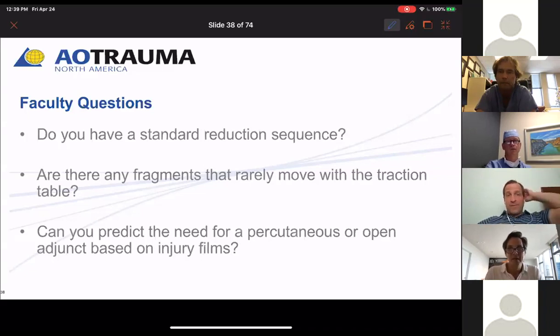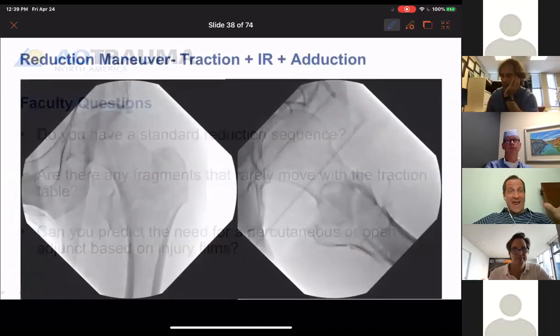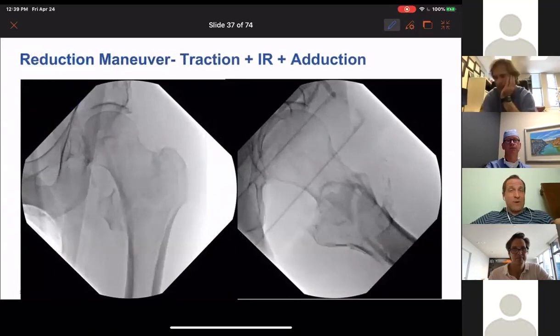Yeah, same. I agree. And then, it's interesting, and you alluded to it a bit, like, so this lateral hip view, which is essentially a lateral neck view, if you go back to one of your fluoros, honestly, it looks pretty good to me, and I would probably be close to happy.